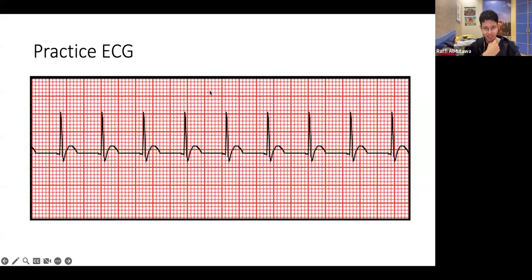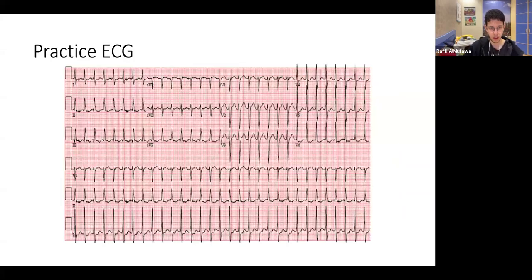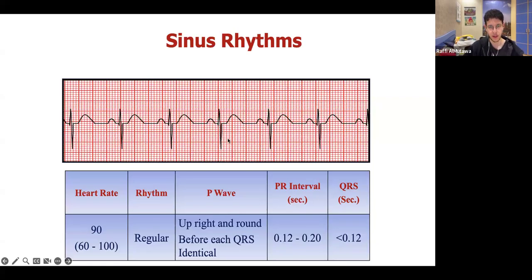All right, so it's a little bit confusing. How about we come back to this? We'll learn through the other arrhythmias because they'll have everything, but we'll come back to this one. Let's go through these first and then come back to those. So here, what do you guys think this is?